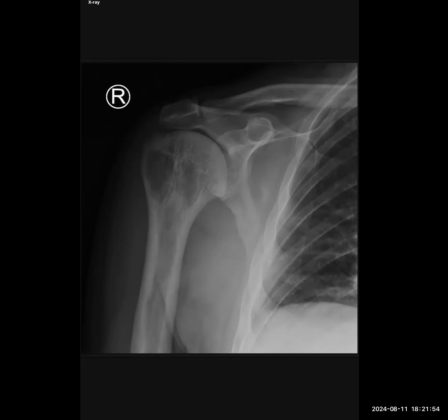I can see that there is a lytic area noted in the greater tuberosity of the humerus, with the rest of the humerus showing increased trabeculations and some cortical thickening as well, especially in the diaphyseal region. It is quite well defined with a narrow zone of transition. There's no associated soft tissue calcification or any breach in the cortex in the visualized sections.